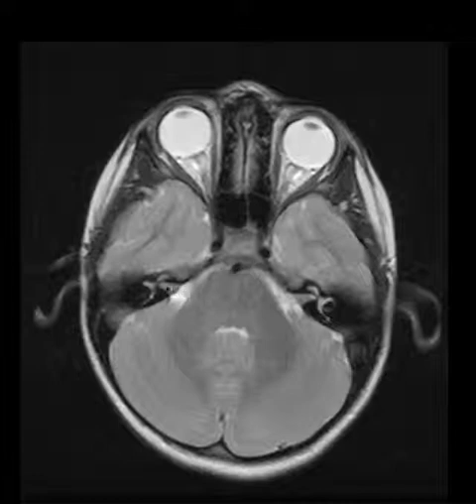Next, we have the structure here that's extending out, which is the internal auditory canal, which houses the 7th and 8th nerve. Then we have the semicircular canal, right here, semicircular canal. This is the left. This is the right semicircular canal. And we have the cochlea, the right cochlea, the left cochlea.